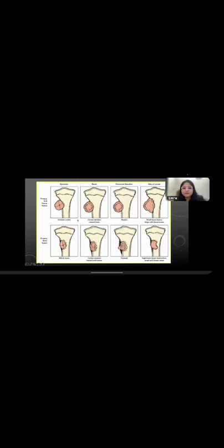Now, soft tissue extension or primary soft tissue tumor. Many a times the primary bone tumors have a large soft tissue component. So there's a doubt in the mind of the radiologist whether this is primarily a soft tissue lesion or primarily a bone lesion. To answer this question, you have to see the epicenter of the lesion, the beveling of bone, periosteal reaction and size of the lesion. And there is a small diagram which helps you to differentiate between soft tissue and bony lesion.